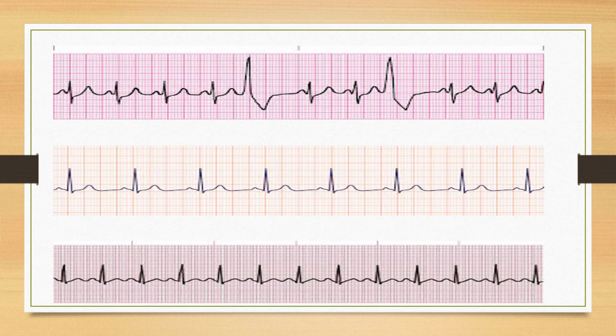What are these two beats that are electrical depolarizations? Those are PVCs, right? That's where the ventricle is a bit irritable and it suddenly just depolarizes itself and causes a PVC. So this person's pulse would be regular, regular, regular, and then there'd be an extra beat from the PVC, and then regular, regular, and then an extra beat from the PVC.